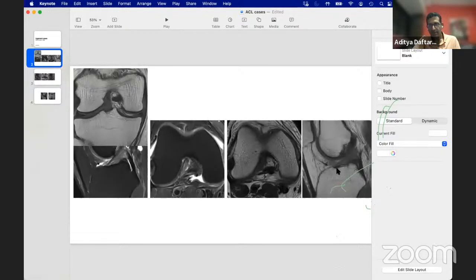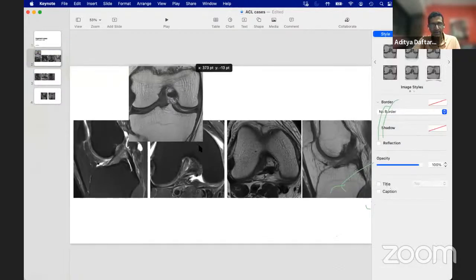Please show the slide again. So please be specific on which slide so I can go back. If you didn't understand something, then let me know. But here are the images.